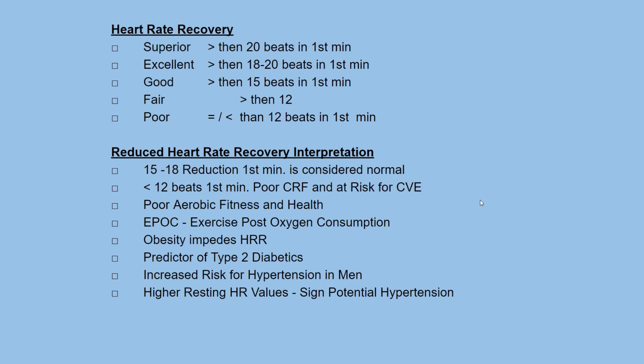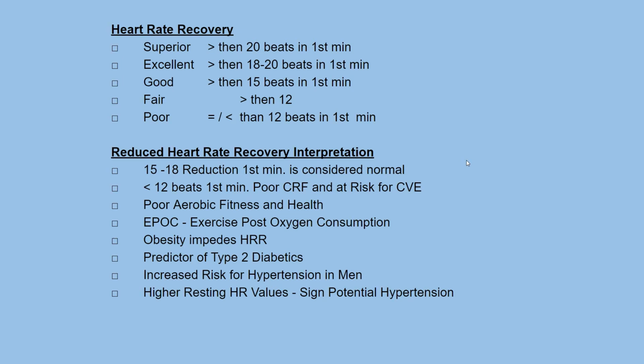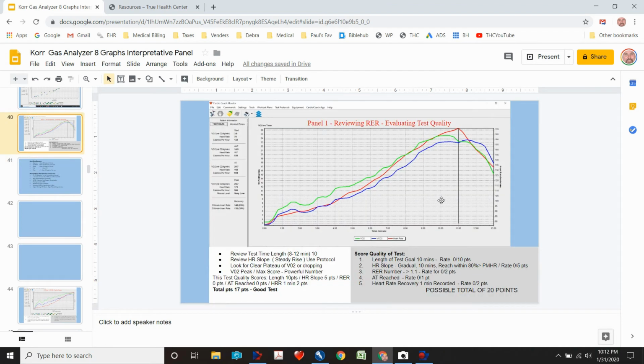So the heart rate recovery could also mean that there might be higher resting heart rate values, which I thought was very interesting. So this is why we are recording it and bringing it into our interpretation, because it definitely has some health related interpretation data that we're going to use when we interpret the test results on one of our patients or athletes or our client.